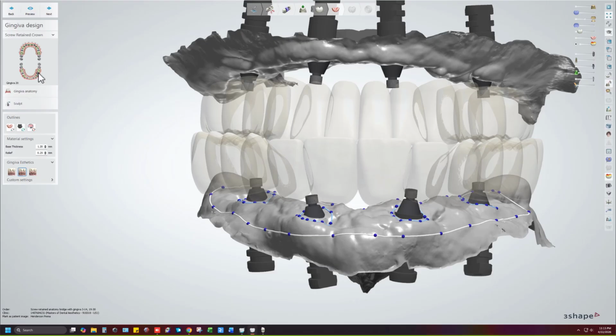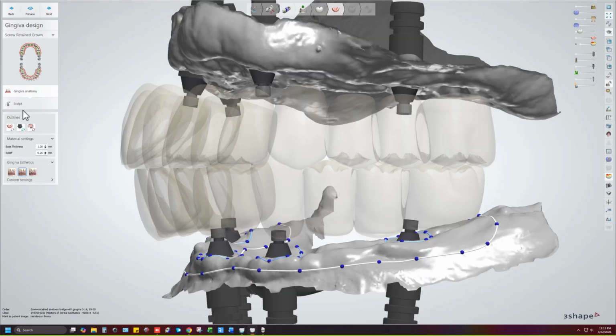That is the lower. We got that, and then we got the lower right there. So sculpt. And again, you guys got your settings here. I don't do the pink relief. It's just problematic, and I don't find a need for it. So this is probably going to be the longest loading time.